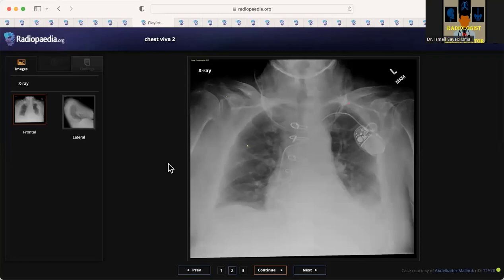This is an elderly patient who presented with cough. Yes, please, candidate 5. Yes, go ahead. This is a frontal chest radiograph of an adult patient who presented with shortness of breath. I can see a pacemaker insertion, probably in a single chamber. I can also see median sternotomy sutures and cardiomegaly. There is obliteration of the left costophrenic angle in keeping with pleural effusion, also blunting of the right costophrenic angle. I can see bilateral fine interstitial reticulation with cephalization of the pulmonary vessels.